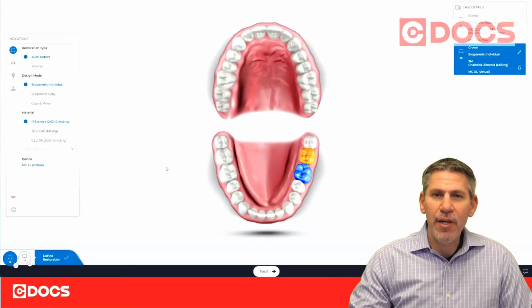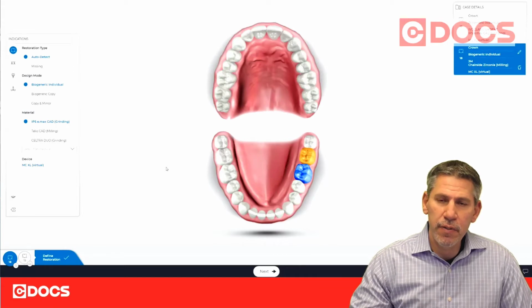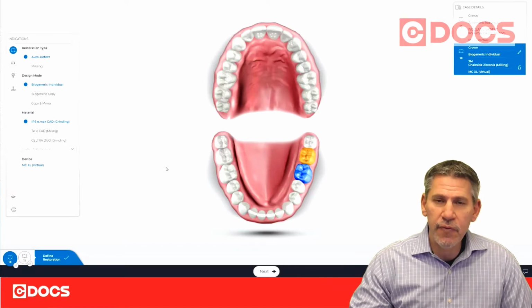I'd like to talk about one of the more useful features of the software, the virtual articulator. This comes in really handy not just with multiple restorations, but with single crowns as well. And it's a feature that's often not used in the software.